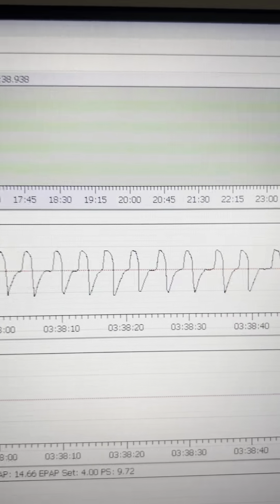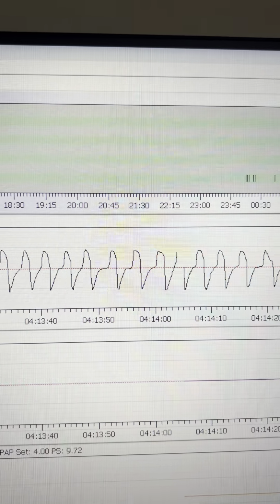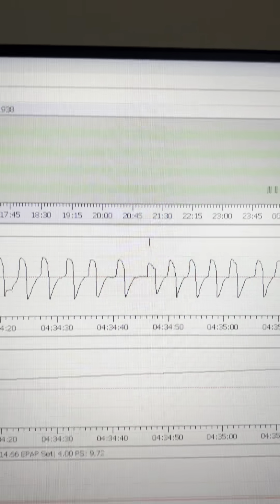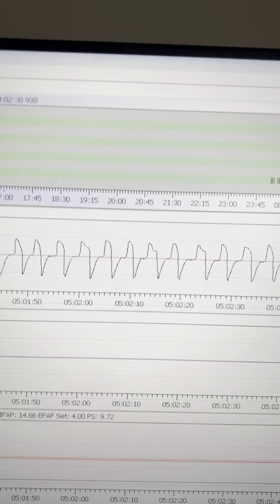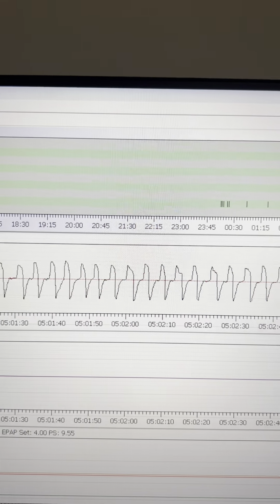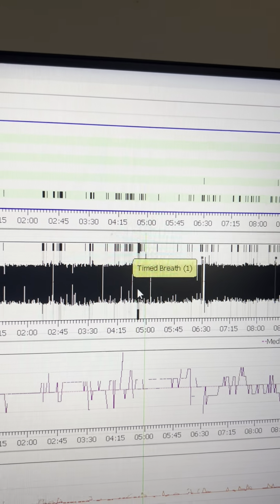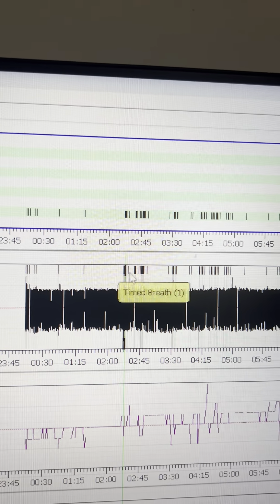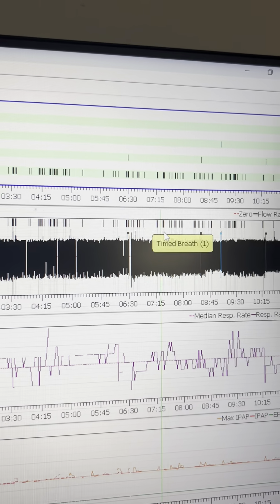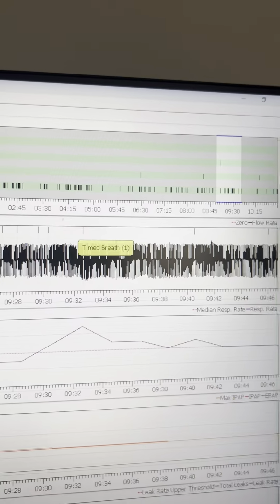I think later on I'm gonna show you guys. There should be more REM sleep, like you can see it from, let's zoom out. All of these parts where it has all of these ones lined up, those are more like REM sleep stages. So I think maybe right here.